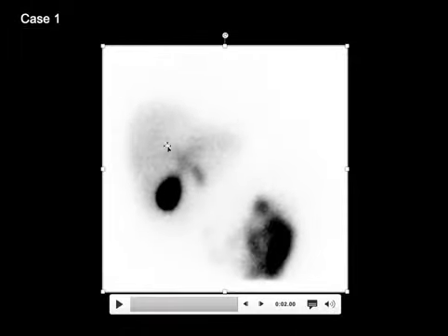Let's look at a normal HIDA scan in a cine mode. So we are looking at 60 images, each acquired 1 minute per frame and played together as a movie. So we see that there is good uptake of the tracer into the liver. The cardiac blood pool activity, which is faintly visualized initially right there, disappears very fast, and then the liver excretes the tracer into the biliary system. We see the activity getting into the gallbladder, and then we see activity going from CBD into the small bowel.